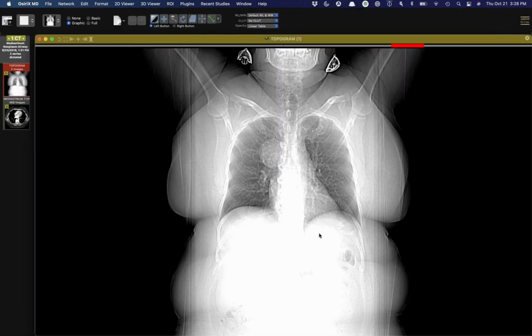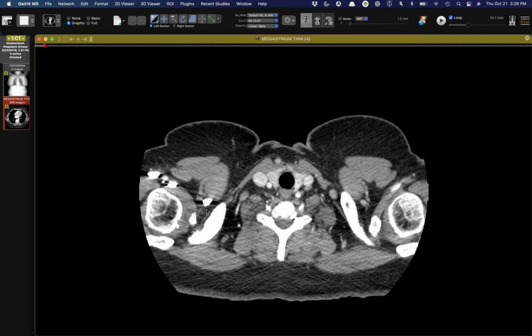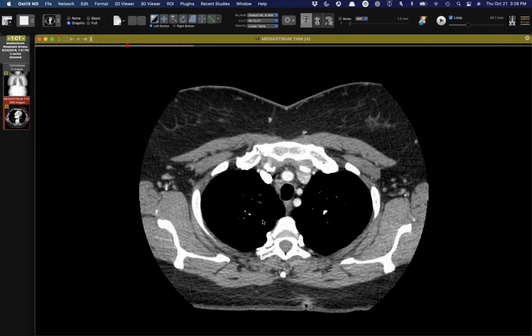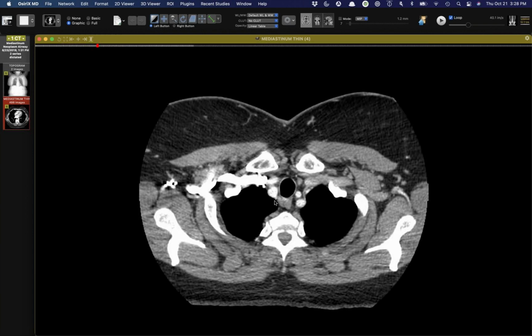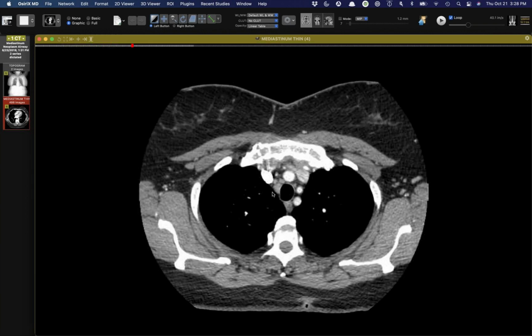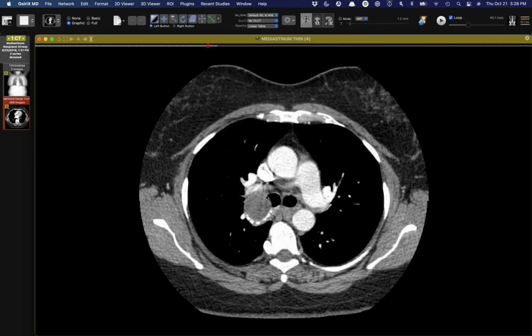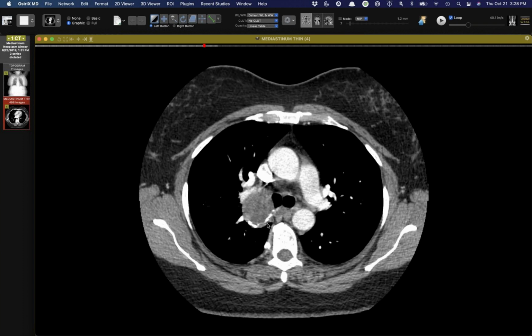And then this is just a quick one. I don't have a radiograph. This is outside, and this was actually incidentally discovered apparently on a cervical spine MRI or CT, where they got low enough to notice that there was something in the chest and worried about lung cancer, got a CT. You can see it's in the right paratracheal region. And here we see, I know I've shown and David has shown, large nerve sheath tumors that kind of descend along the paratracheal region. This is lower down, right at the right tracheobronchial angle, and even indents that right main stem bronchus a little.